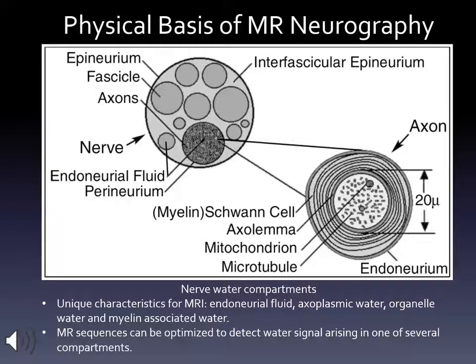Endoneurial fluid is a low-protein fluid with long T2 confined to the endoneurium of nerve fascicles. Compressions or irritative processes appear to be capable of increasing the amount of this fluid relative to the other cellular components of the fascicle in a variety of pathological conditions. In the MRN, we will therefore be highlighting the swelling and hyperintensity of the nerve.